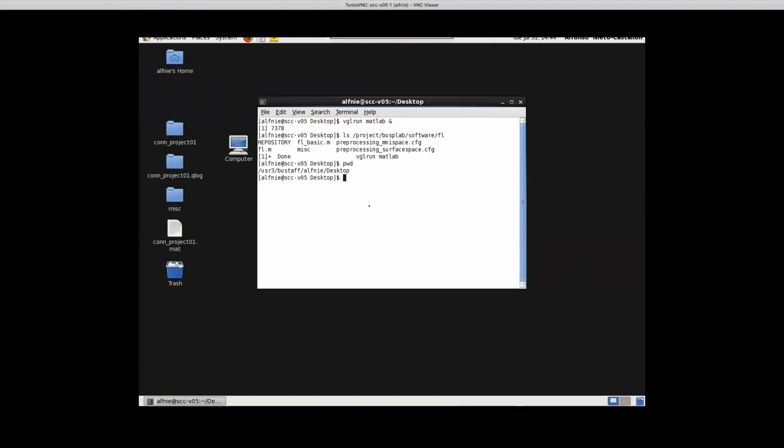That could be any arbitrary number. So for every subject, you have a different surface that contains a different number of vertices. And then you have the information in a file that is called lh.sphere.reg and rh.sphere.reg that tells you how to match that variable number of vertices within that subject surface to FS average interpolation.